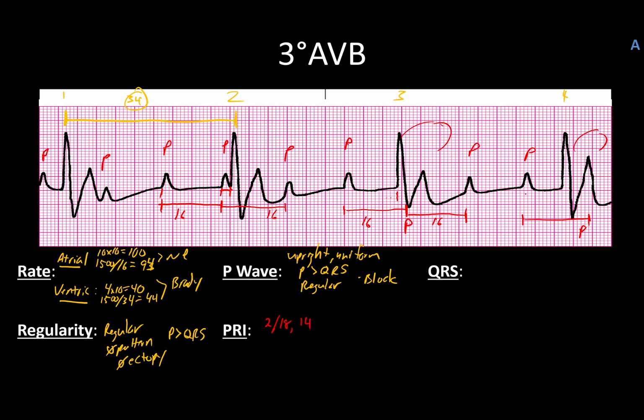And then my next one, I'm looking at 5, 6, 7, 8, 9, 10, 11 or so. So again, those are just wildly inconsistent. And to that end, they don't reset, the pattern's not there.